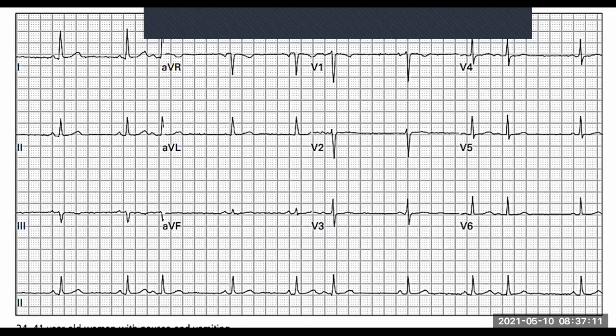So if you were to put your hand on the pulse, you get dum, to dum, dum, to dum, dum, to dum. It would keep on following that particular pattern. All right. So if we really look at it, let me break it down a little bit more. If we were to really break this down, what we would see is that we've got, can you see these are kind of regularly spaced? Okay, not all the time, but kind of regularly spaced. And then we've got these little ones that come in between. Okay, so that's kind of giving us a clue as to what's going on. I'm not expecting an answer. I'm just giving you an idea.